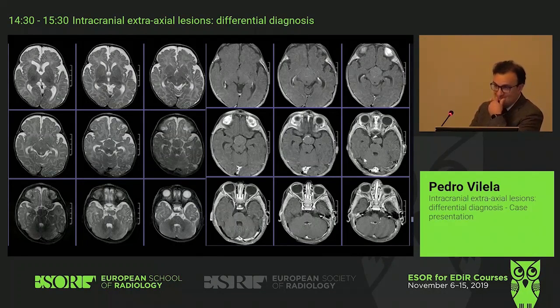So, what can this be? It would enhance? Yeah. Could have some mass effect and some edema. This seems to be well tolerated without edema. Or, the name is not that one, it is hamartoma. It's a very typical location of hypothalamic hamartoma, presenting with seizures, pediatric population.